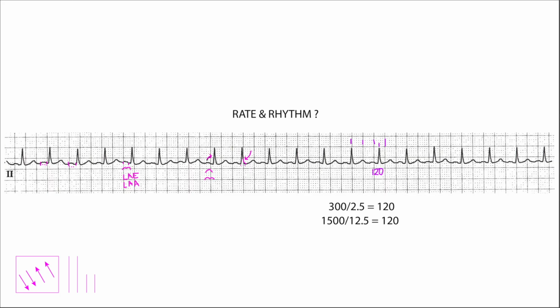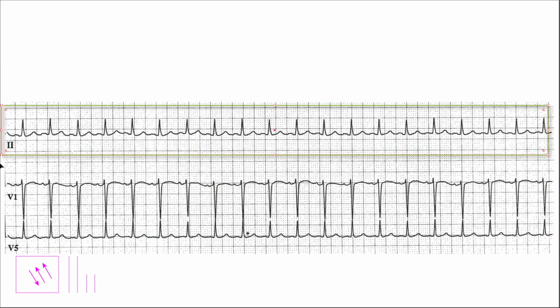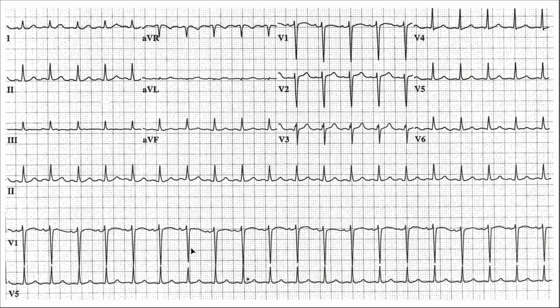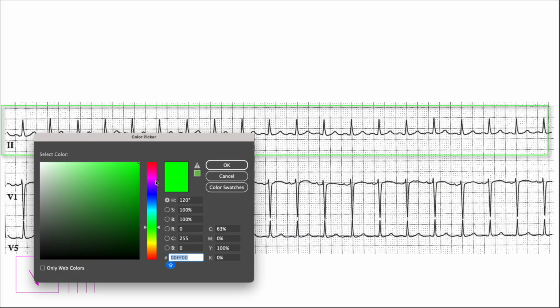All right, moving along. So we're expanding our view. The lead 2, single channel, 10 seconds. This is the exact same thing we were looking at a moment ago, and we're just breaking down this big ECG. So we're not looking at different time frames, we're not looking at different ECGs. First thing that stands out to me here is that my color is not magenta.